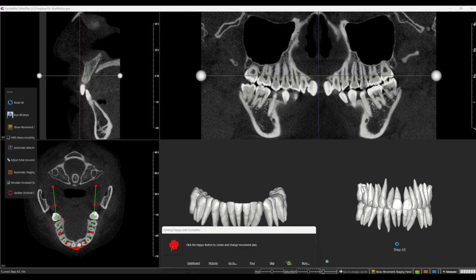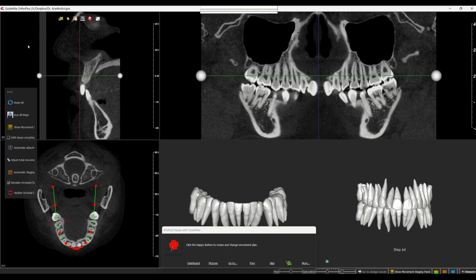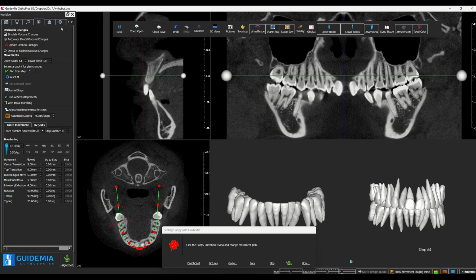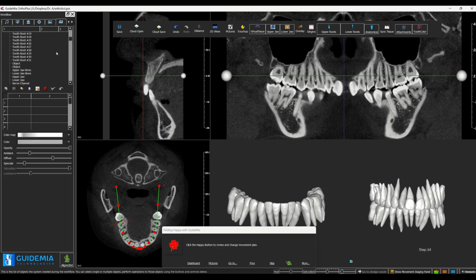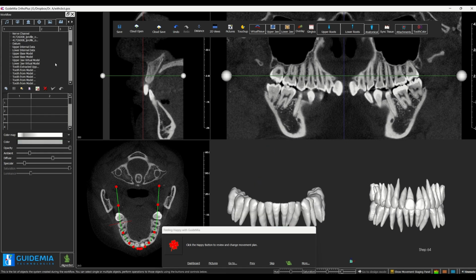Sometimes in a CBCT scan, the AI couldn't get good root models. The situation is like, for example, front teeth, they touch each other for the entire crown and even extend to the root area. And there could be fillings and bad restorations or scatters on the roots. So in that kind of situation, we need to modify or fix those roots.